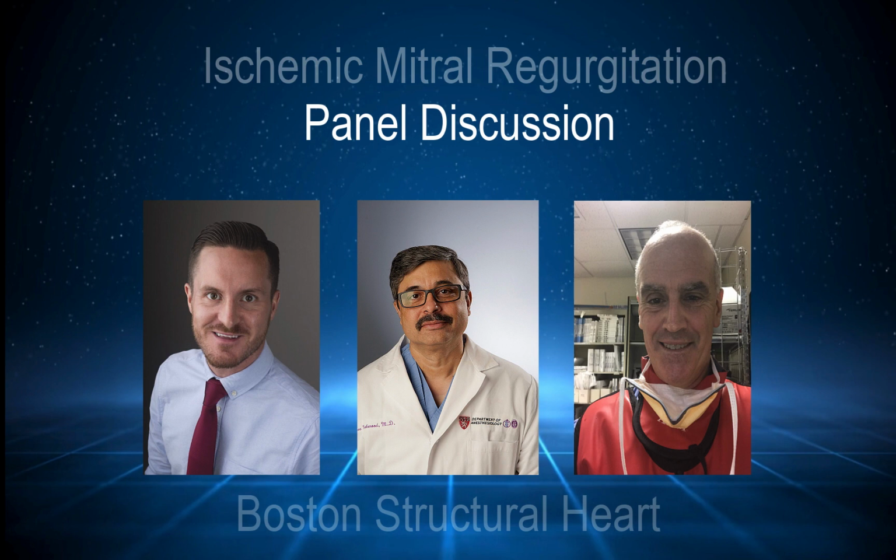Yeah. Now, getting back to these cases in particular, your 3D volume set prior to bypass, it didn't look like it was the biggest valve area. And I noticed that none of the presentation had any measurement of valve area before or afterwards. So in the presentation, no, but we do routinely use our multiplanar reconstruction, and we will planimeter a valve area.